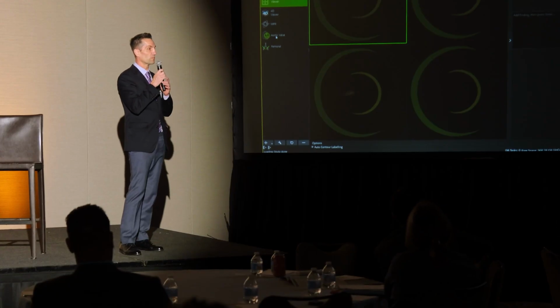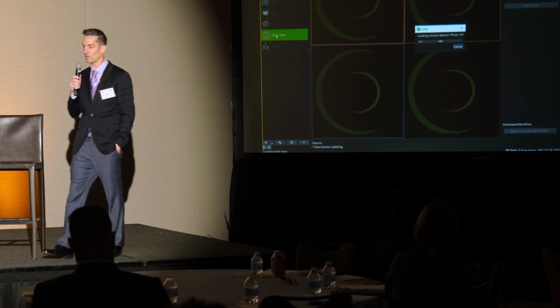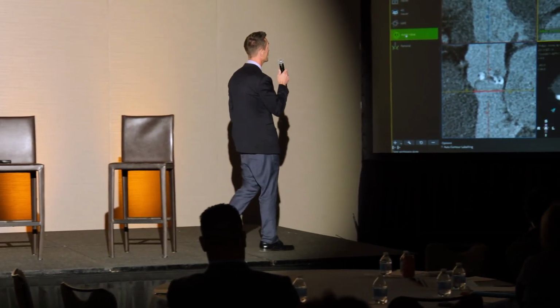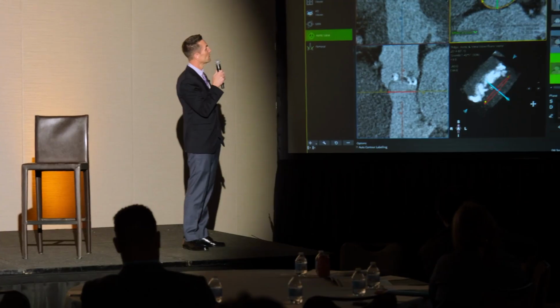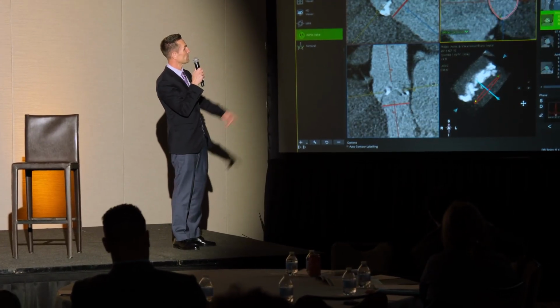So again, the most important thing with TAVR is you're really trying to quantify that LV outflow tract with high accuracy. So we can see here how quickly it goes and gives you all of your measurements that you need for your TAVR.